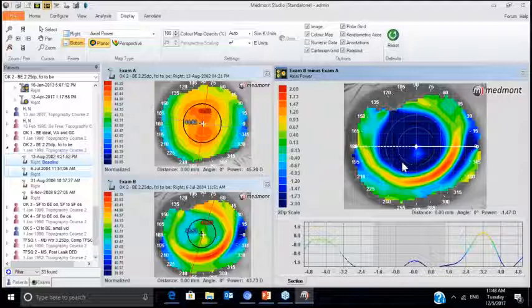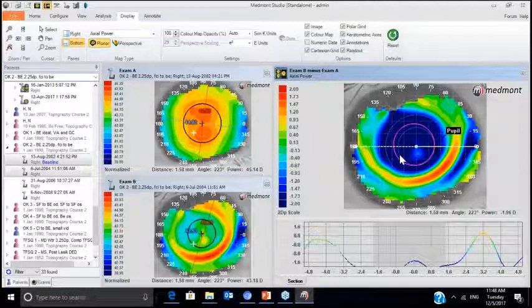And what we first see is with an axial display, you notice the blue treatment area relatively well centered to the pupil. So overnight, this contact lens appears to be placing its effect or its treatment well centered to the central cornea, the visual axis, and the pupil.